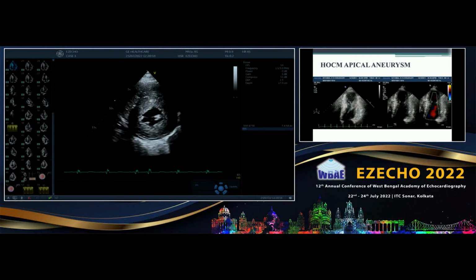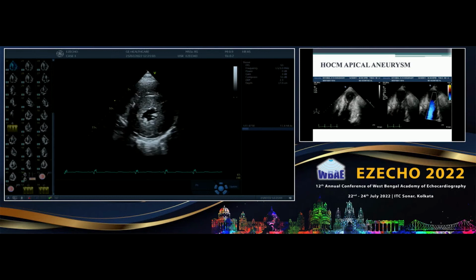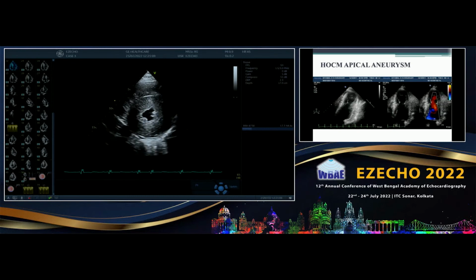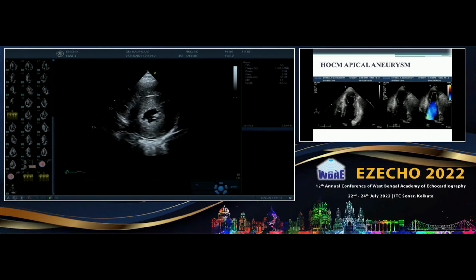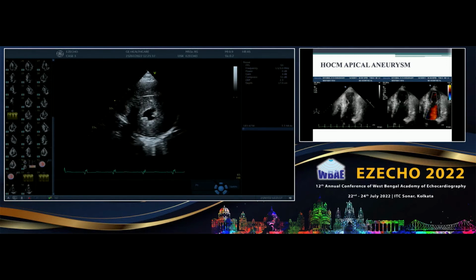So you can have a mitral valve here itself, it is perfectly fine. See, you can see that this papillary muscle is rotated slightly anti-clockwise. Generally, you will have a papillary muscle here and one papillary muscle here. This is already rotated. Now, if your commissures get oriented in this direction, though this doesn't look extreme, some of them have got somewhere here. If your commissures get oriented in this direction, remember the AML is like this, PML is like this.